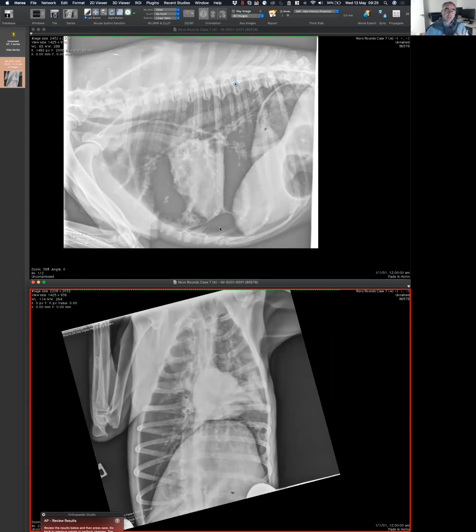And the other one that I think is happening in this particular case is that we are overexposing so much that there is fat in the mediastinum here that we don't see, but is there. So if I take another radiograph, I bet this soft tissue heart is going to be against something like more fat. And then you will not have an impression of elevation of the heart. So that is all my thinking, for and against the pneumothorax, why yes, why not.